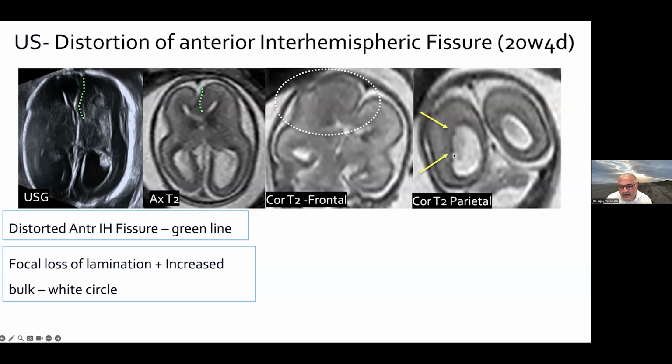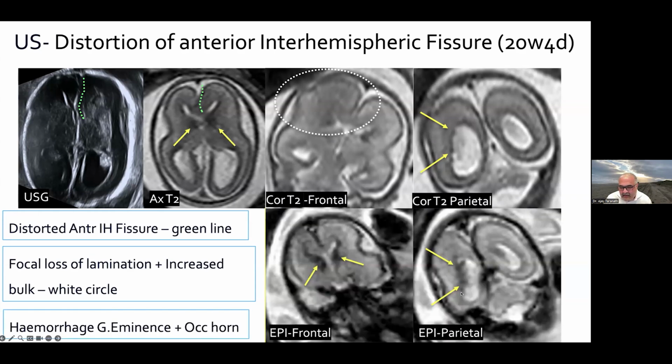We also picked up a few T2 dark nodules along the ependymal lining of the ventricle, which on the EPI show areas of blooming, and there's this subtle area which is further in from the ependyma within the lumen, which is also blooming. The ganglionic eminences demonstrate blooming as well. So this looks like a case of a dysplastic megalencephaly, an mTOR pathway disorder. Some people refer to it as the mTORopathy.